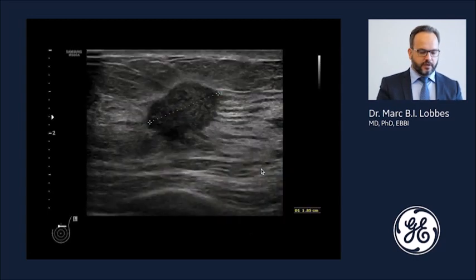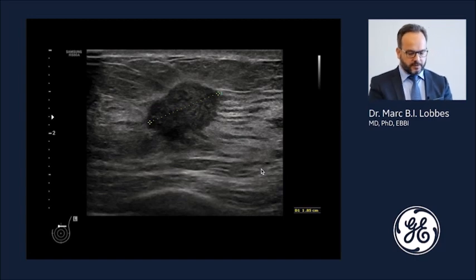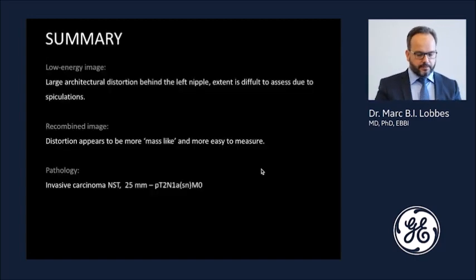Based on these findings, we performed an additional targeted ultrasound and found a suspicious mass. We biopsied this mass, and it turned out to be an invasive carcinoma of no specific type of 2.5 centimeters, also lymph node positive.